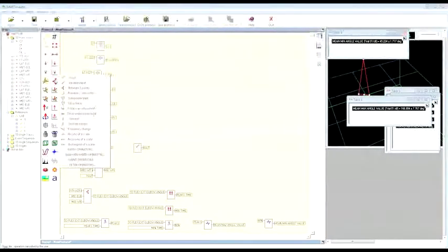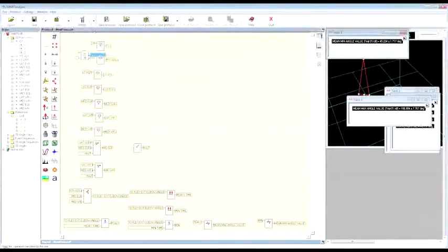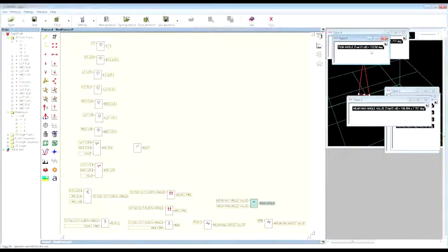To do that, I can click on 1D angle, choose the map operator and select the difference between the two objects. From angle, the first input will be the max, and the second is the minimum. So this is the difference between the two that gives us an idea of the range of motion.